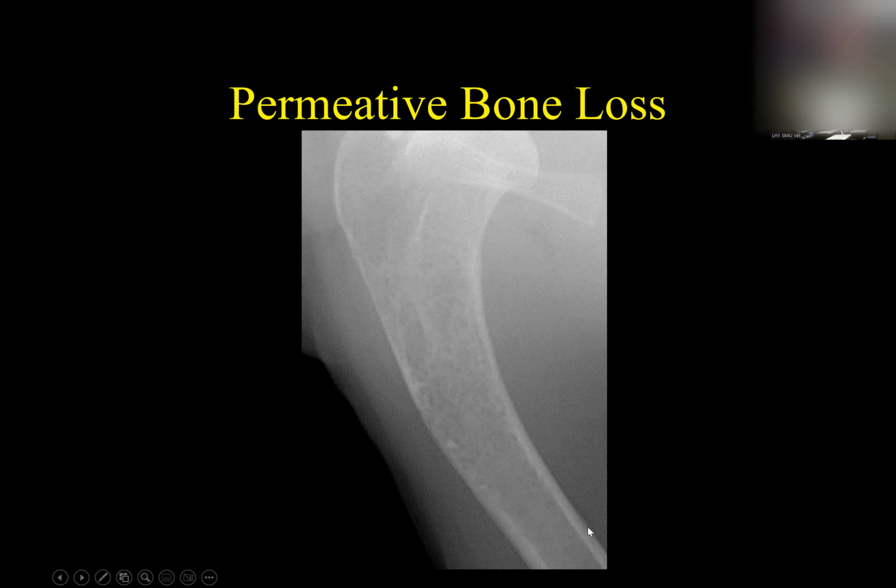Look at this nice, thin, well-defined cortical bone that's normal down in here and here. But if I go proximally, it becomes really thin here and super thin up here. And that's because that cortical bone is starting to be lytic, it's starting to be eaten away. And if you look real close, right up in here, we're starting to see a little periosteal reaction here. That's a smoothly marginated periosteal reaction that's in that part of the bone that we're starting to see here. Give that time, and that's going to become more lytic too.